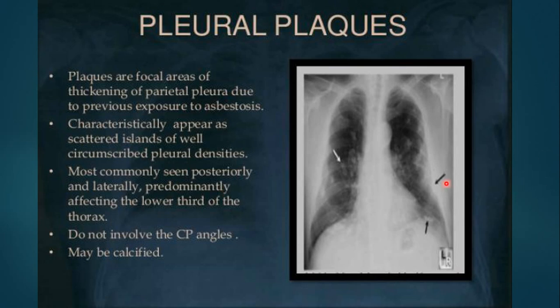There is a pleural density or a soft tissue density here and here, multiple scattered, okay. You need to take AP and lateral views to confirm that these pleural densities or opacities are situated within the pleura, not within the lung, okay. So you need at least 2 views to confirm. CT scan will help you with that if it is difficult to appreciate.